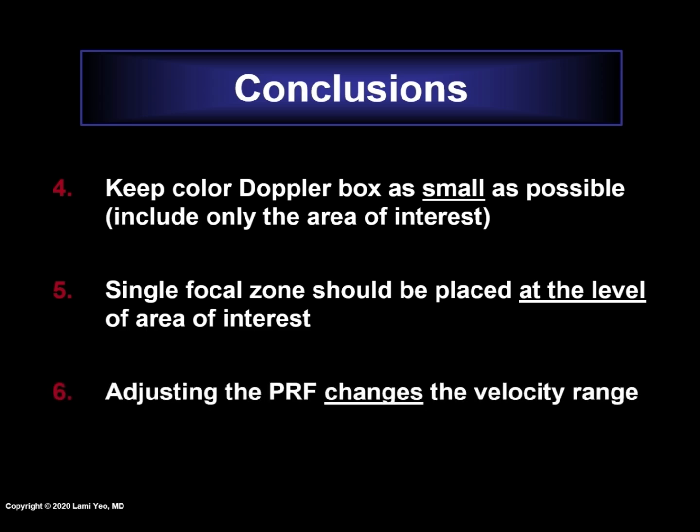Adjusting the PRF, or pulse repetition frequency, changes the velocity range. Both are directly proportional to each other. When performing color Doppler sonography, the PRF should be optimized all the time to represent the real color velocity of the studied vessel.